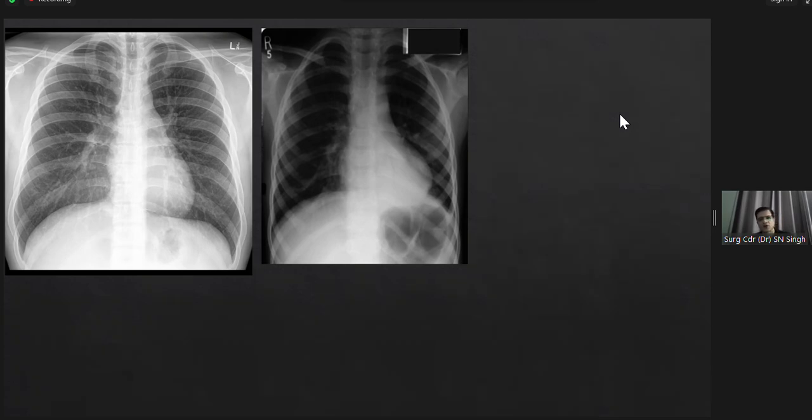So now you have described this as chest X-ray frontal view. Everything else is normal. There is a retrocardiac opacity with the apex towards the hilum. The left hemidiaphragm is obscured. Maybe the left paravertebral stripe probably is obscured. The left heart border is visualized. Where do you think the lesion is? Anterior mediastinum, middle mediastinum, posterior mediastinum?